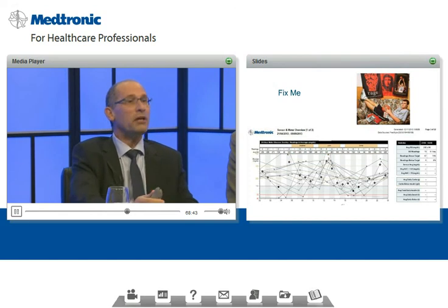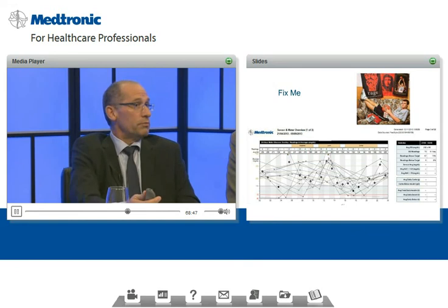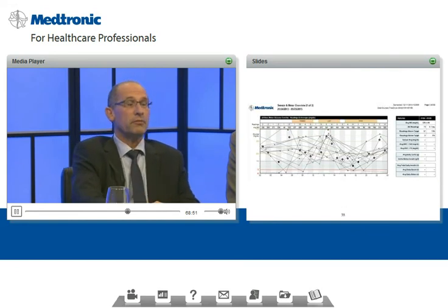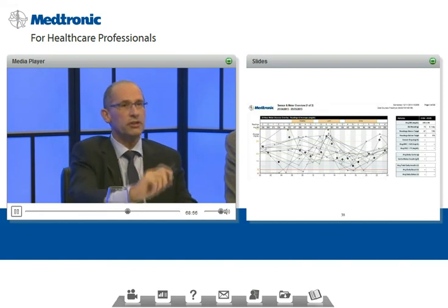Treat me. So my question for you, you're sitting in front of this guy. He comes with his blood glucose meter. He's out of control. He's downloading this. This is all the information he has. He's downloading this data. Just look at the data for a second.